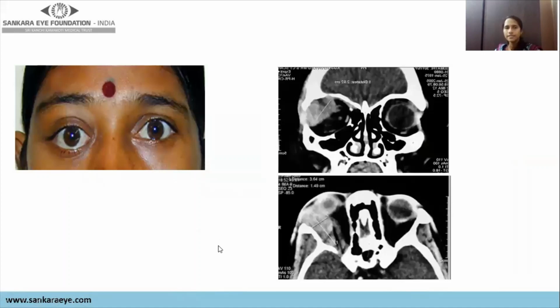And then the next situation: here you are seeing a 35-year-old female showing a fullness in the superolateral orbit. There is a palpable mass here with inferior dystopia, and there is a drop in the vision, and the symptoms have been present for around 4 to 6 months. So when you see the clinical image and radiological image, I'll read it.